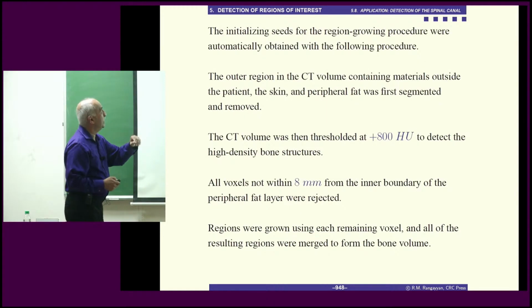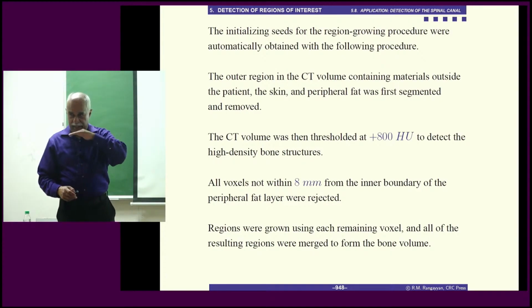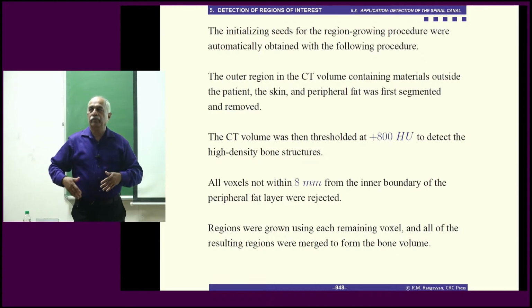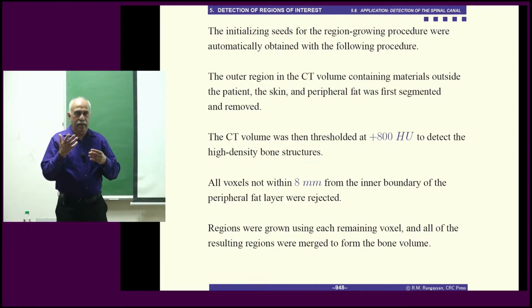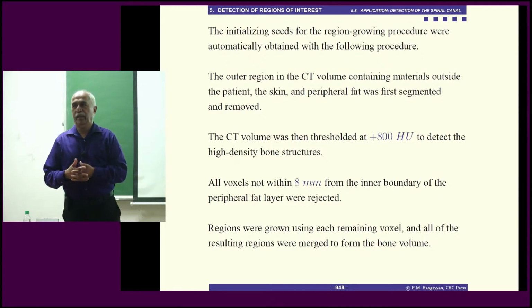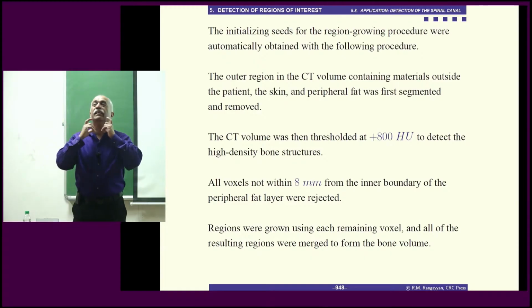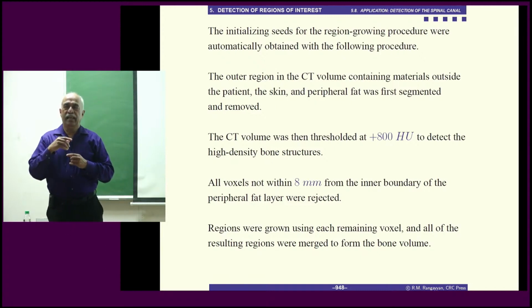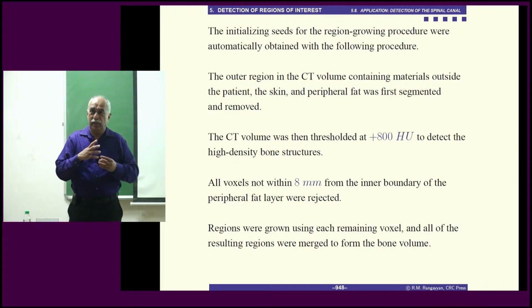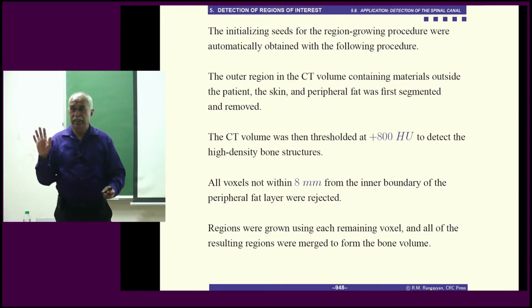Okay, one thing is missing here. The section of the spinal canal, not the whole spine, the spinal canal inside the vertebral body is circular in this region. In the neuroblastoma cases, the images were of the abdomen and partly into the pelvic cavity and the thorax, but not the main chest area or the neck area. In the neck area, the spinal canal becomes almost triangular in shape, and in the chest area it could change shape a little bit, but in the abdominal area it is mainly circular. As you go lower into the pelvic area, again the shape changes.